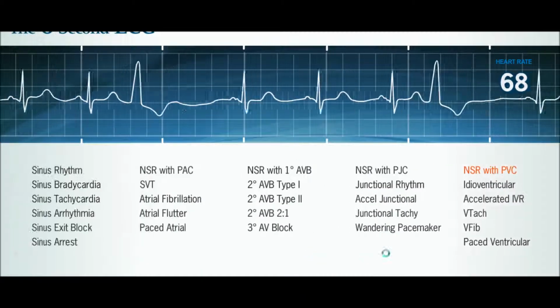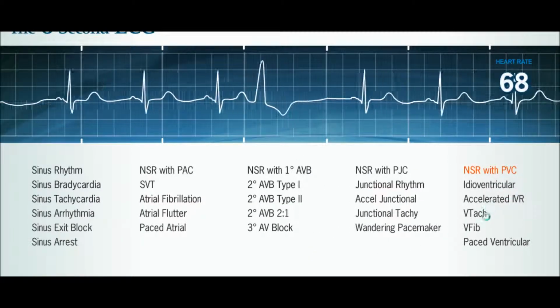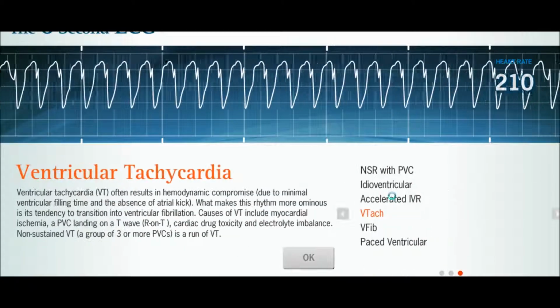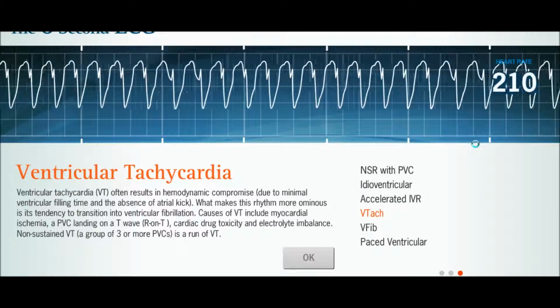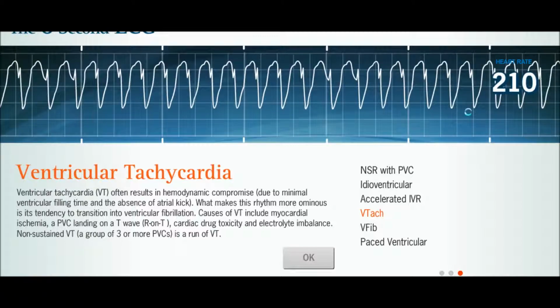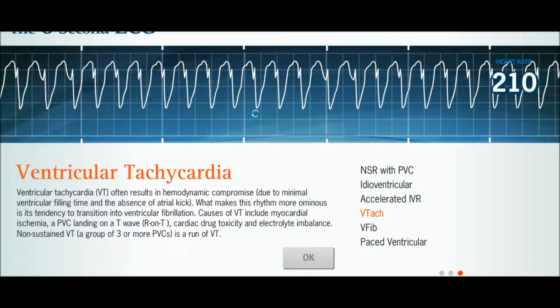Okay, we have two more. So this is a bad rhythm. Okay, this is awful. You never want to see this. This is called VTAC. The way you characterize it, the way you look at it, is if you imagine this was a saw. It looks kind of like a saw blade, doesn't it? Like you cut down a tree with. Nice and evenly spaced, little sharp points. I wouldn't want to have a blade like this come to my arm, and that's the characteristic feature. This is VTAC.